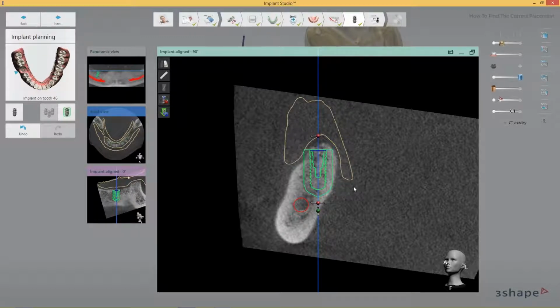Oh, that's actually interesting that you indirectly also use the safety zone to control your three goals there. Maybe the software doesn't warn me, but if I know that I get out into air with my safety zone, then I'm also violating the 2 millimeter around all sides rule indirectly. And here you're close. I'm close, I'm making this decision. Of course, I can just put it up a little bit and then we are home free.